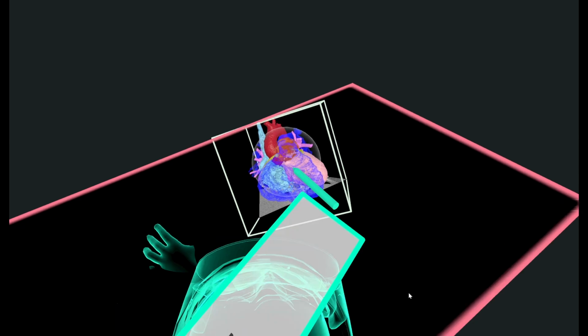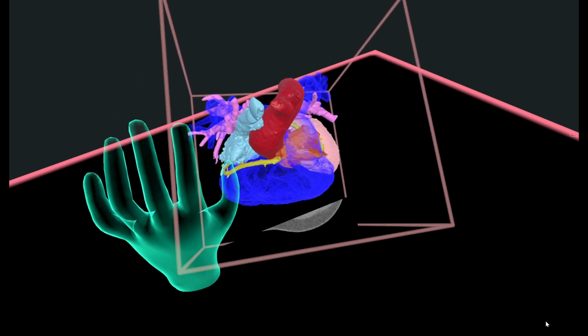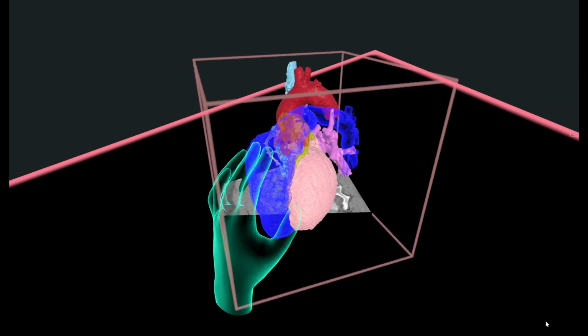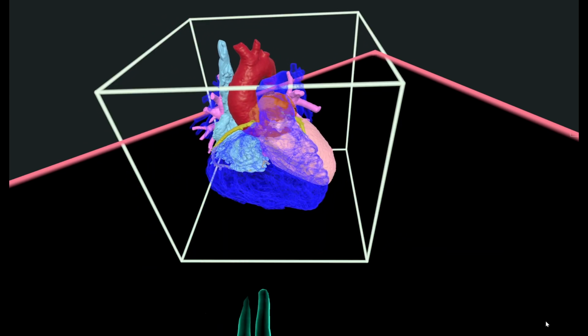So you can see the valve opening and closing in place. And that's a very nice thing to do for patients like with AV canal and other patients that we have a 3D echo of the valves, and we can overlay it over the CT. So this is a complementary imaging for complex patient surgical planning.